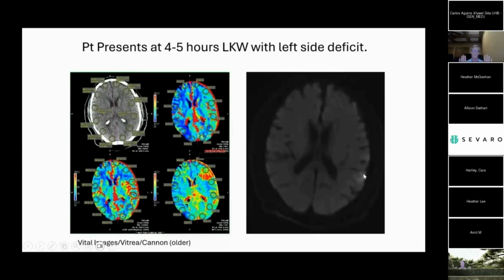So this is what I mean by providing prognostic information. While this is a snapshot in time, we could also determine, in my opinion, that if we were successful in establishing flow to the patient, we could actually help the patient, as proven by this diffusion weighted image.